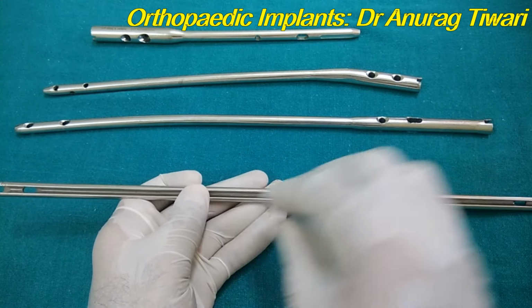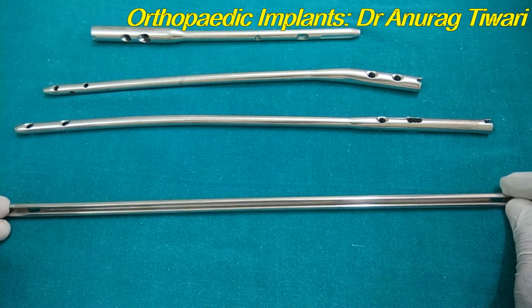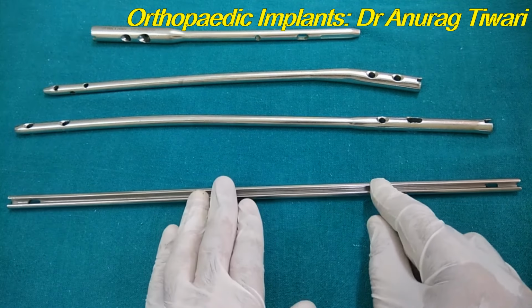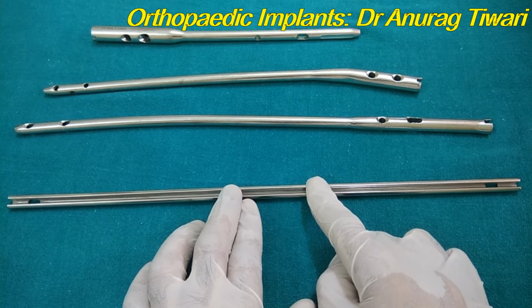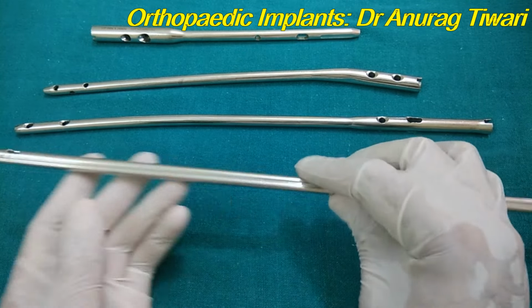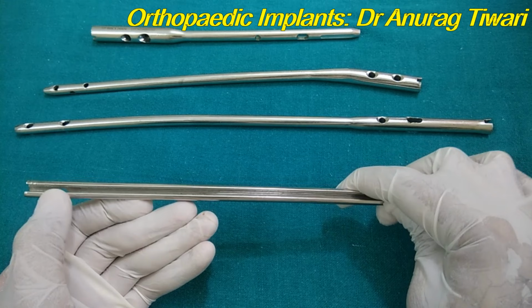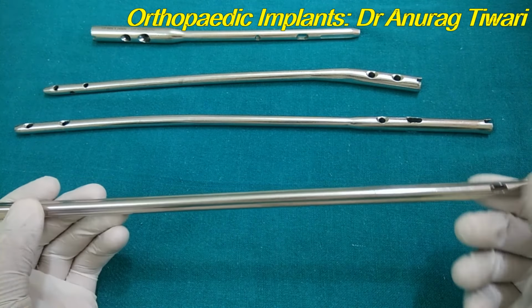Now where should the slot be? The questions which are asked pertaining to the K nail is, where should you place the slot? Always remember the slot should be on the tensile surface of the bone. So the tensile surface of the femur is anterolateral. So the slot should go on the anterolateral side, and the eye will automatically go posteromedial because the eye is diametrically opposite to the slot. Now the second question is, why are there two eyes?